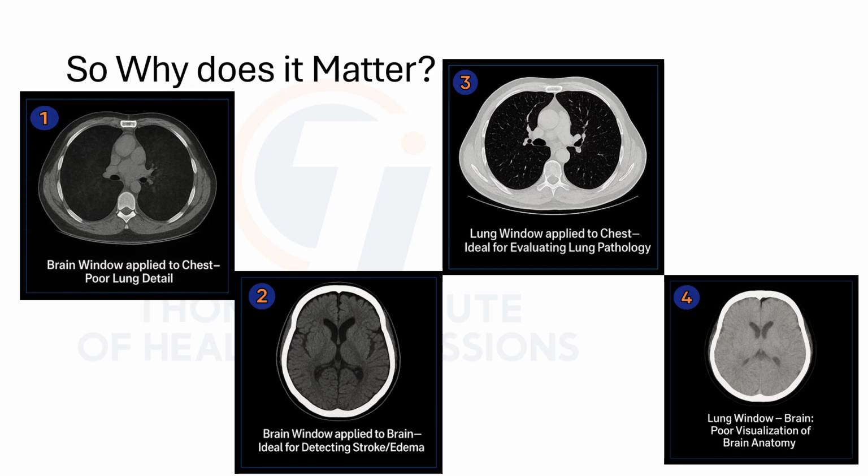So notice how image 2 and 3 each use the right window settings for the anatomy being viewed. That's the key takeaway. Choosing the correct window width and window level makes all the difference in what the radiologist can actually see and diagnose.